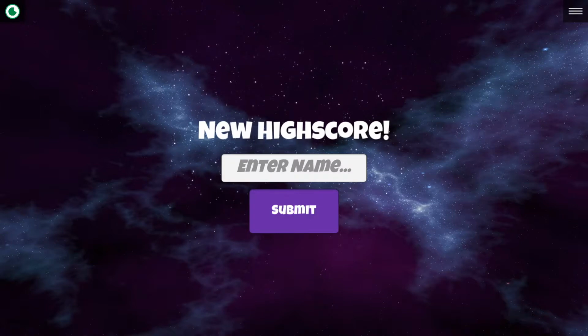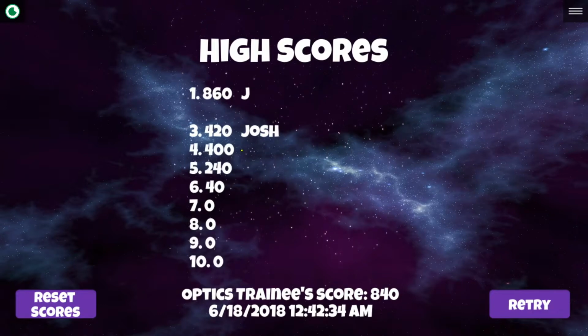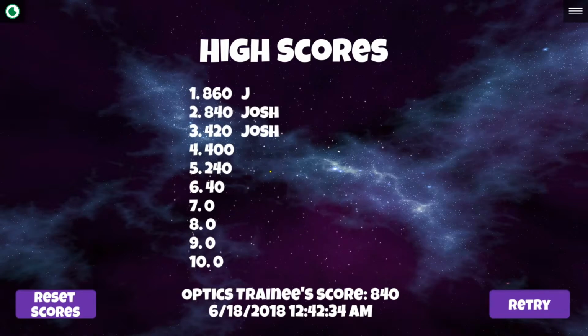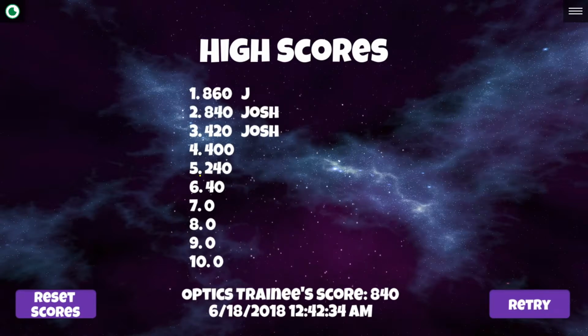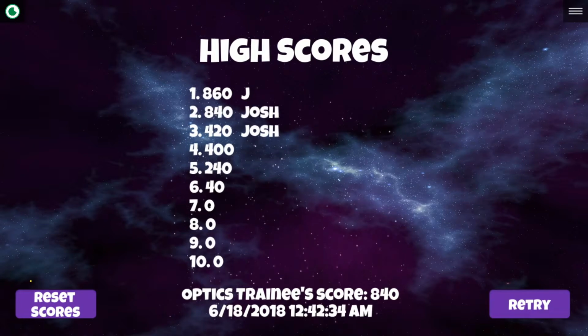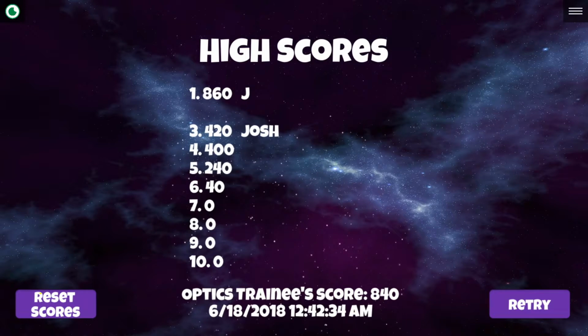So I'll go ahead and enter my name here. You can see my high score flashing on the list. And this is a great way for the kids to compete with each other or with the doctors. I know that there are some doctors that like to set a high score at the beginning of the week so that their kids can compete with them. And they can reset the score every week if they wish by clicking the Reset Scores button on the bottom left-hand corner here.